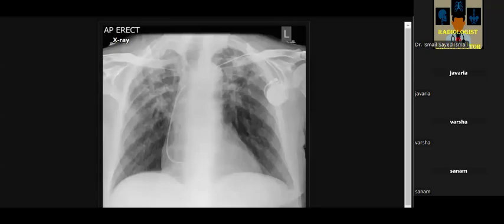Patient has a chronic history of dyspnea and cough. I'm provided with a radiograph, chest frontal projection, of an adult patient in which I can see fibrotic changes and interstitial thickening with reticulations in bilateral upper and mid zones. There is relative sparing of the lower zones.